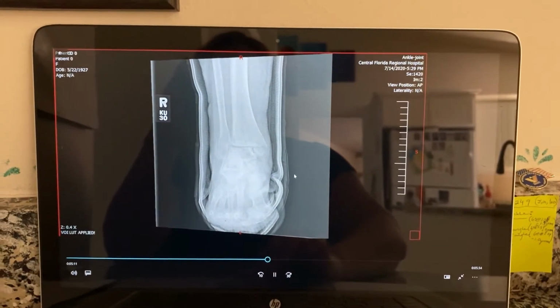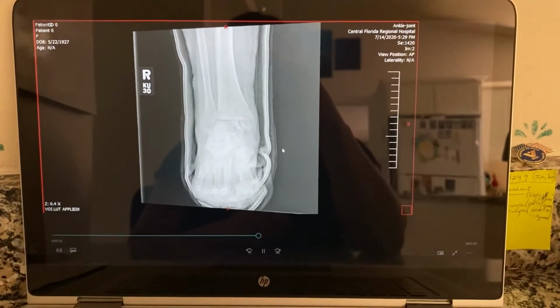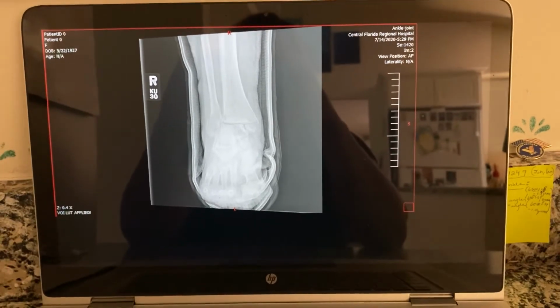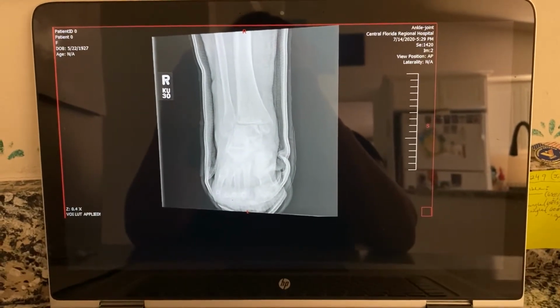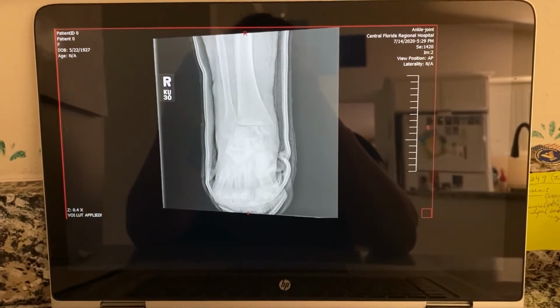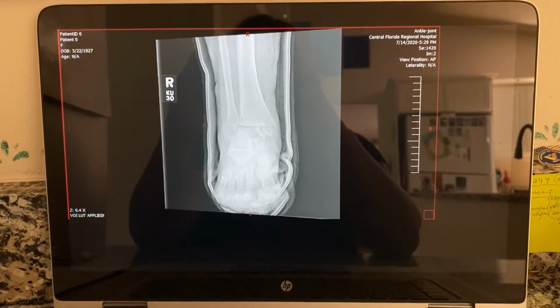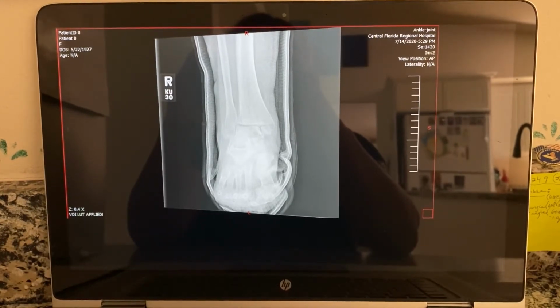Again, collimation could have been a little tighter to clip off the toes and only include the metatarsals. However, because of the angle and distortion, I wanted to be sure to include all anatomy. The technique used was a digital AEC, 65 kVp at 1.59 mAs, with a negative 1.9 reading in the green.